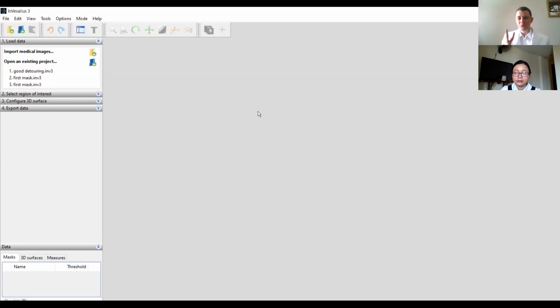So you must have two files. You have a file which is named easy and one file which is named hard. Mình sẽ có hai file, một file được đặt tên là easy là dễ, và một file đặt tên là hard là khó. Okay, why? Because in one file, the mandible and the maxilla do not touch, so the software has no trouble separating the two. And in the other one, the patient was taken in occlusion, so you have to separate the mandible from the maxilla.